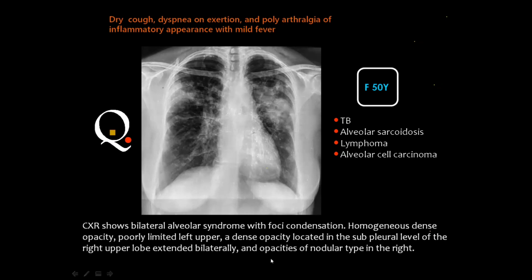What is the report that you should give to the patient? You say that I am dealing with bilateral non-symmetrical opacities in both lung fields, together with numerous scattered pulmonary nodules. I do not see evidence of enlarged lymph nodes, and the costophrenic angles are clear.